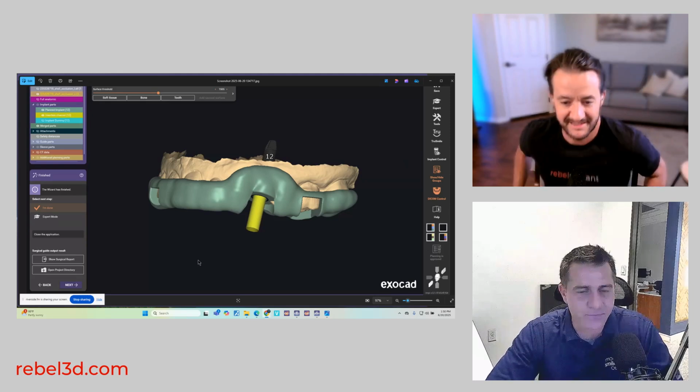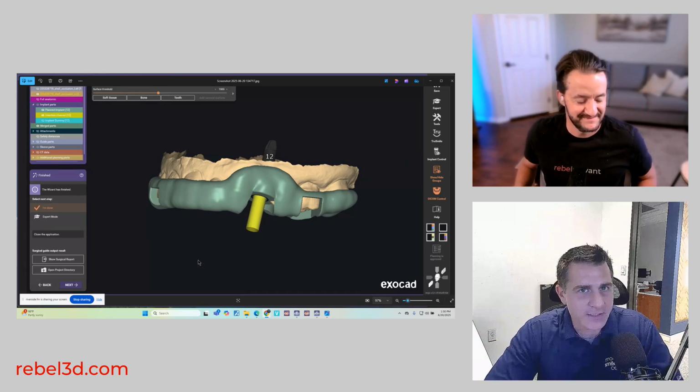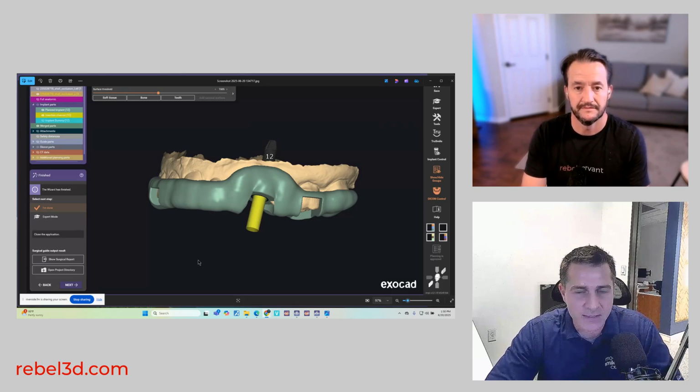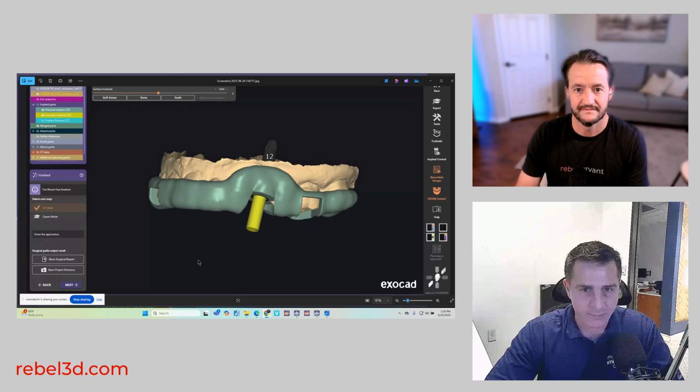Awesome. Thanks, Rob. Thanks for having me back. Exoplan is another version of Exocad, but it's planning software for implant surgeries. As someone who loves CAD dentistry and digital dentistry, the next obvious step for me was to start planning my own surgical guides for implant placement rather than relying on having someone design it for me and then waiting to get it back.